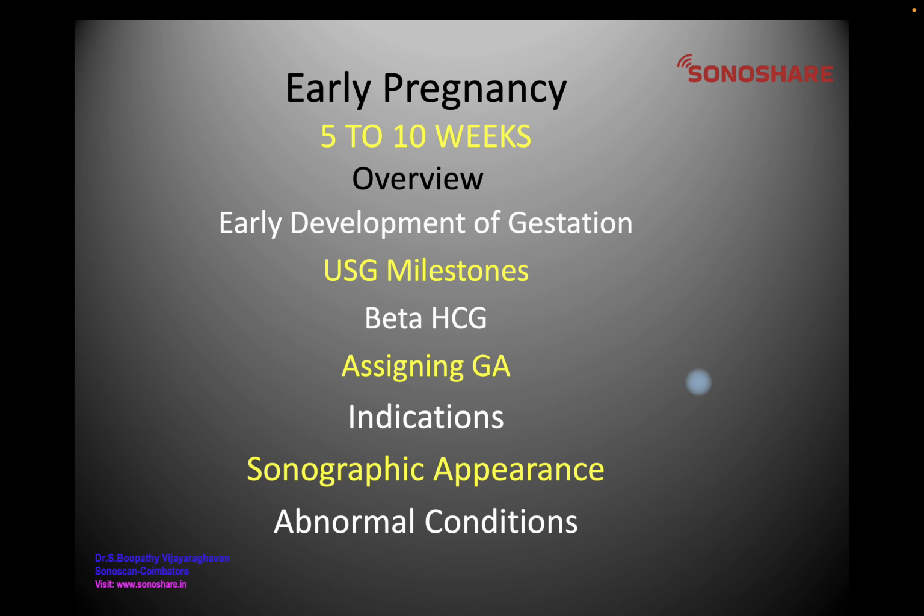The sonographic appearance of the pregnancy between 5 to 10 weeks and abnormal conditions during this window of pregnancy will be dealt with in this lecture.